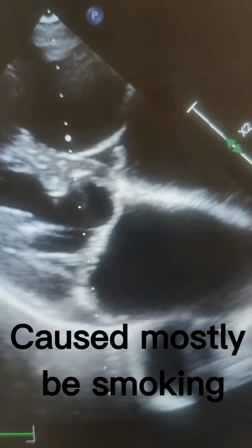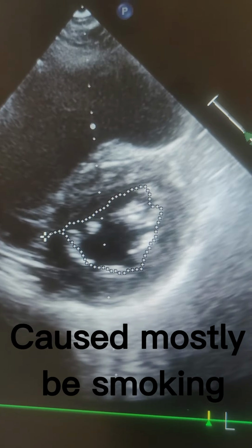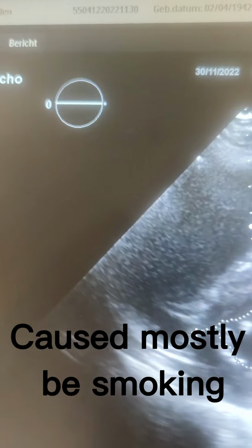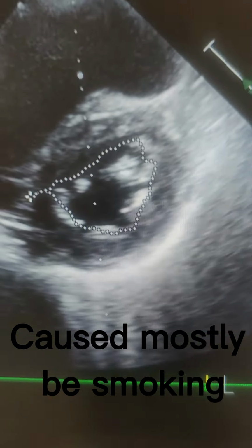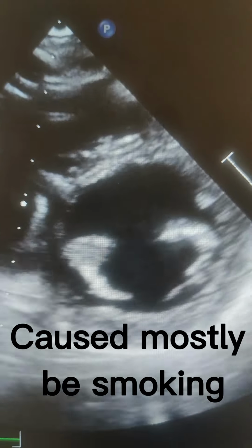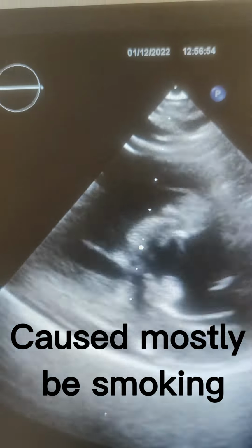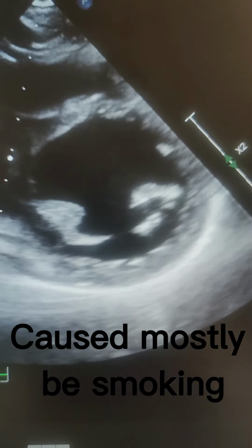I will tell you what is causing all this problem and how you can go about it. As a result, the left ventricle now in the septal area is straight, giving it a D-shaped formation. Due to the pressure from the right ventricle, the left ventricle septal wall has been flattened, giving it a D-shaped formation. This is what it normally looks like in a normal patient. The left ventricle is round and there's no pressure from the right ventricle on the septum to make it flat.